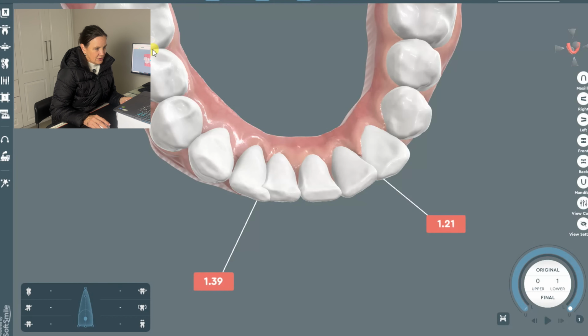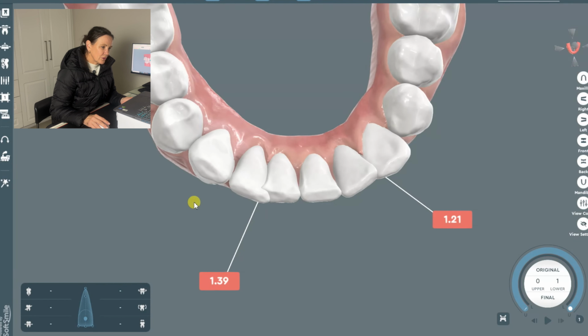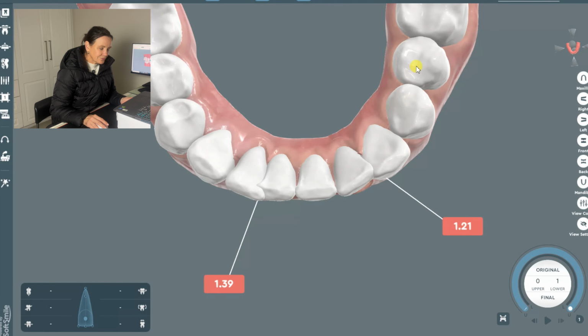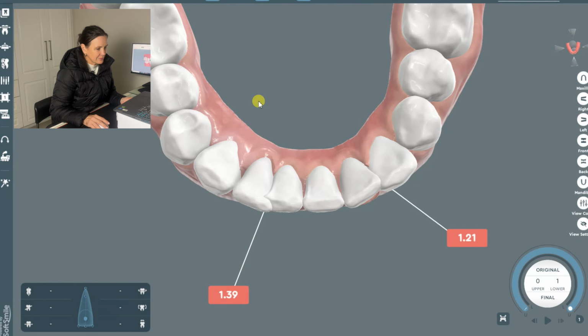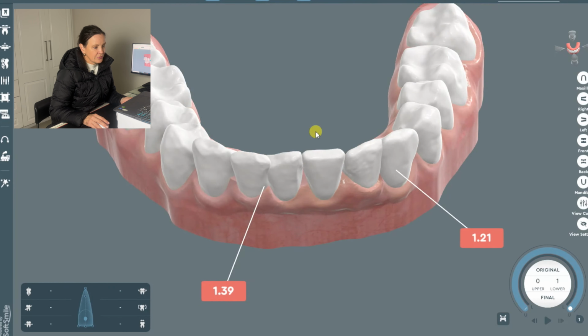If we go between the 6 and the 5, 5 and the 4, 4 and the 3, and we do 0.5, 0.5, 0.5, that's a lot. That's really a lot. 0.4, 0.4, 0.4 would be 1.2, then we're still not there. And on this side, 0.4, 0.4, 0.4. So yeah, that starts becoming a possibility, to do interproximal stripping medial between the 6, 5, 4 and the 3, and that side as well.